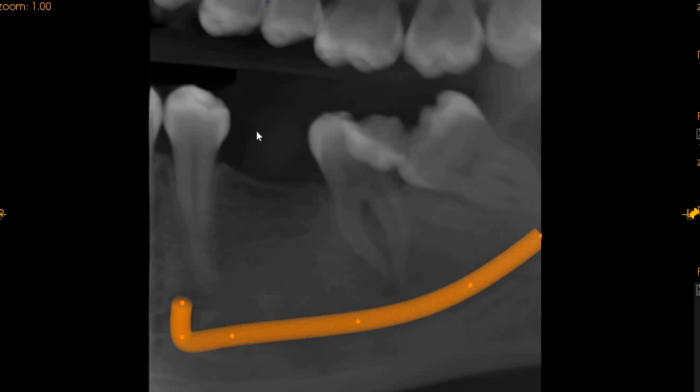This is the sagittal view. On the sagittal view, this is the edentulous area, the inferior alveolar nerve, the lower left second molar, and the lower left third molar. Now, this is a segmental CBCT, so we were not able to get the apex, but nonetheless, we will be taking you through all the pathologies and all the landmarks of this tooth.